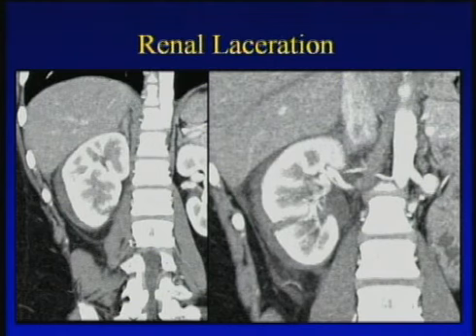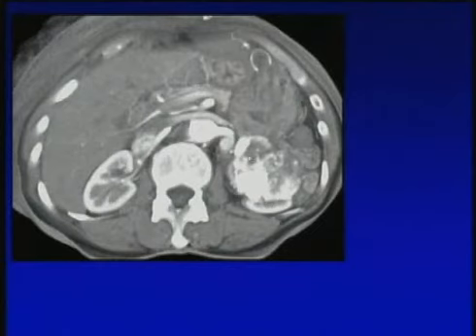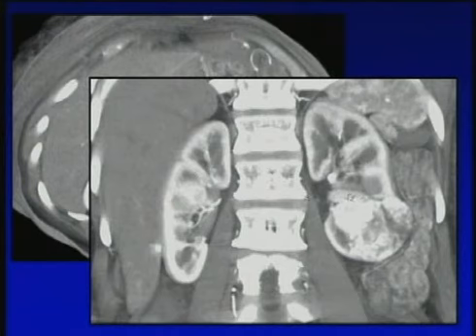Other applications in terms of early phase imaging, the question about renal trauma, changes, subtle lacerations, as in this case, are very easy to recognize in the cortical medullary phase. In terms, of course, of contrast extravasation from the renal pelvis and calyces, you need excretory phase imaging. This is also the ideal phase in renal trauma if you're looking for the presence of pseudoaneurysms, of course, or looking for active extravasation from arterial structures. We know that 85% of renal cell carcinomas are hypervascular, and we'll touch on that a bit later.